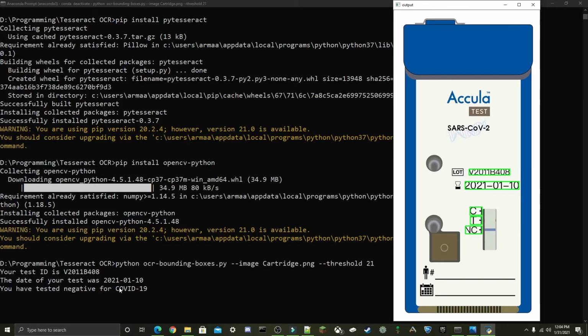For this demo, I use a Tesseract pre-trained model, but you can train your own from a custom dataset as well. This can improve accuracy significantly. During testing and refining, I had to increase the size of the text, or it wasn't even detected. Even now, the program doesn't interpret the text entirely properly.